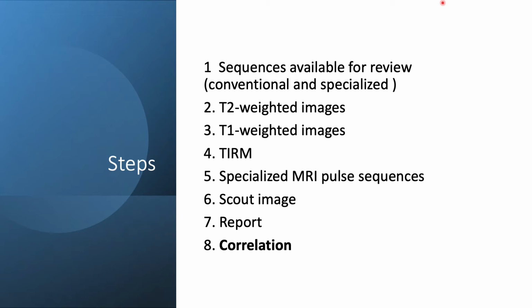Now you know the basic steps of interpreting an MRI, either it be lumbar, cervical, or thoracic, or a whole spine MRI. Let's go on to see what are the basic steps when you actually are sitting in front of an MRI. How I do it is in 5 easy steps. It is as simple as A, B, C, D, and E.